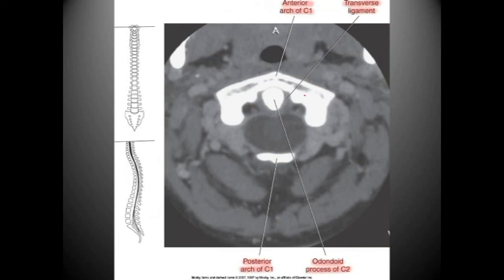So here we actually see CT. We have the transverse ligament running here, the odontoid, anterior arch, posterior arch, spinal canal or vertebral canal. This is probably spinal cord here. At the trachea, or better, this is let's say oropharynx to be more accurate at this point in juncture.